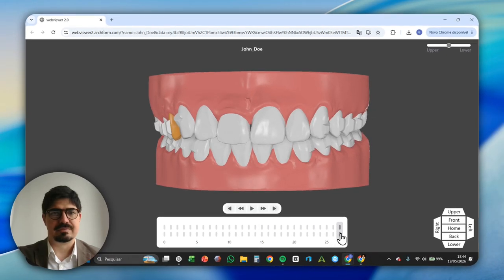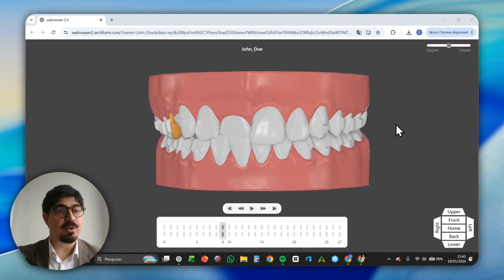it is just for visualization purposes. And this, my friends, was Archform in under 25 minutes. I hope you guys like it, and let's change some smiles together.